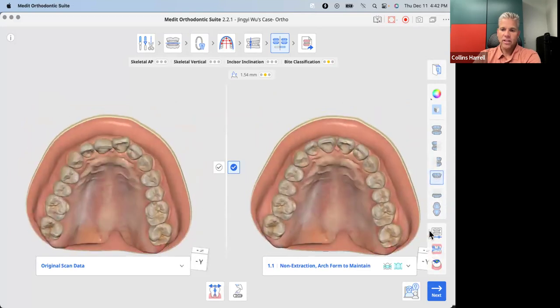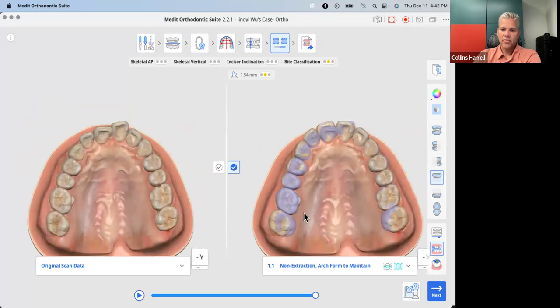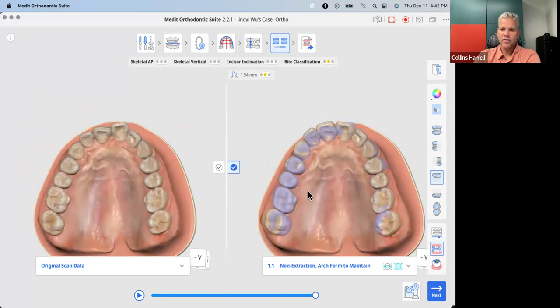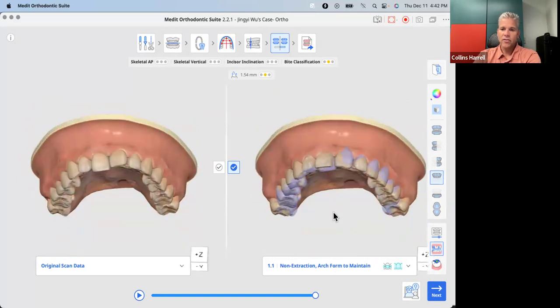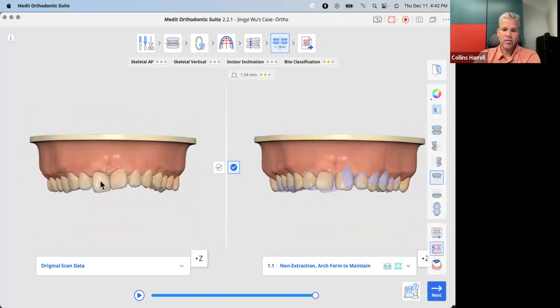Let's see if it's symmetrically expanded. When you look here, it looks pretty symmetrical, as far as you don't see a lot of expansion on one side versus the other, but you do see a difference between the extrusion and the intrusion. And you can see that when you look back over here at how much there's a vertical difference left versus right.